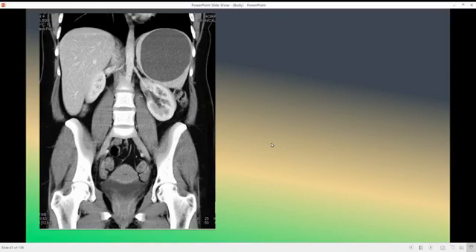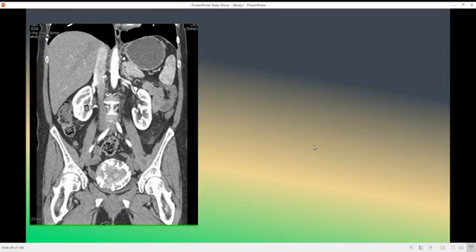Okay, very good. Dr. Amani Nabil, splenic cyst, and Tariq Dawood, it is splenic cyst. Very good, both of you. Okay, splenic cyst. As we see here, this is a splenic cyst involving the spleen. This is a coronal format image. This is a splenic cyst. Okay, we move to the next case. What do you think about the next case the patient has?